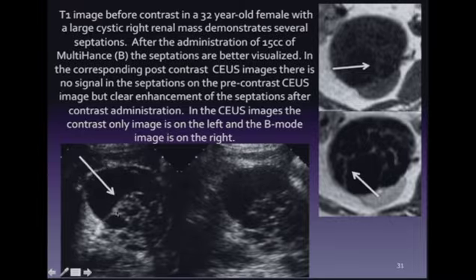But on the ultrasound with contrast, we have a much higher resolution because we have much thinner slices. We can see that a marked network of irregular septations is present, all of which are enhancing, and again, in this cystic renal cell carcinoma.